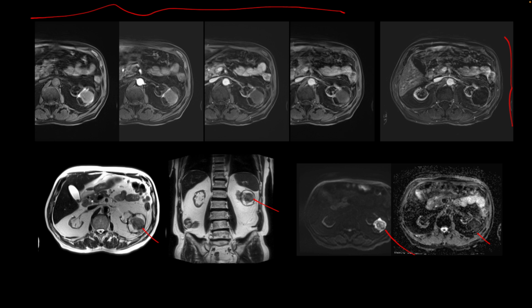And so here we find that at the site of the tumor there is a focus of hemorrhage, and there is some encapsulated fat. There is no true enhancement to suggest a residual or a recurrent tumor, and on follow-up we only see fat, and the hematoma has gone away.